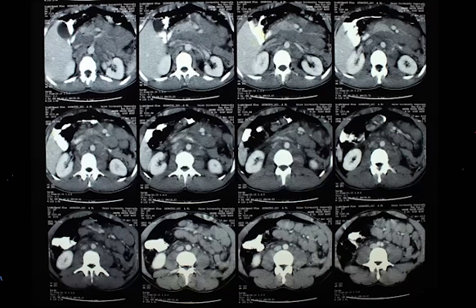Why do you say there isn't any, Nour? There are a lot of them. You can see that part of the bowel that is very close to the liver, where it's the hepatic flexure. You can see it, and you can see part of the bowel that is the duodenum, containing contrast, to your right-hand side. Oh, there are loads of areas of the bowel that contain contrast.